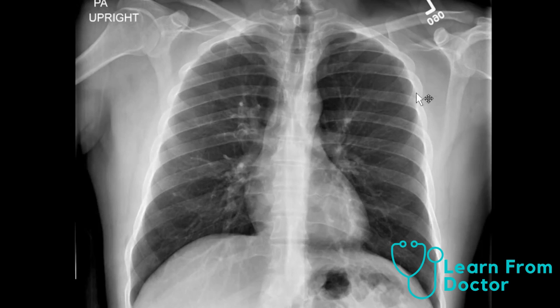Next, what I finally do, I look at the airways and the lungs. So what I do is I follow down my trachea onto the right mainstem bronchus and left mainstem bronchus, making sure there's no filling defect or mass within the trachea or foreign body which would be aspirated. I then take a look at my lungs. I get an overall feel for what the lungs look like, take a right and left.